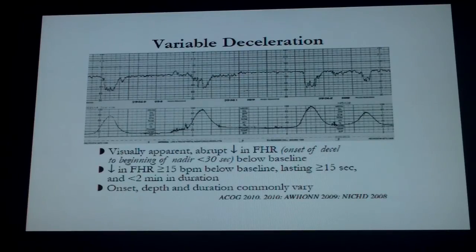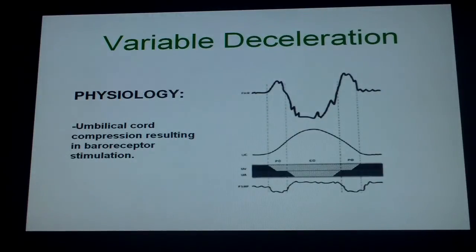We used to have what we called a variable deceleration with a late component, and that's just something you don't see anymore. You don't look at the timing. The timing doesn't matter because the physiology is the same regardless of when it happens. And so let's talk about that.